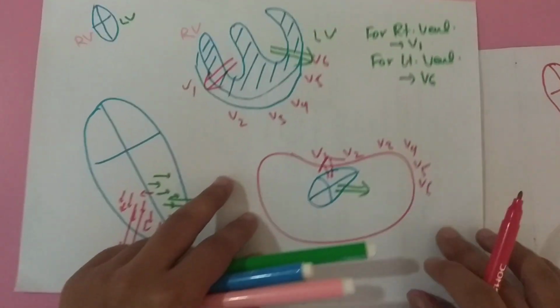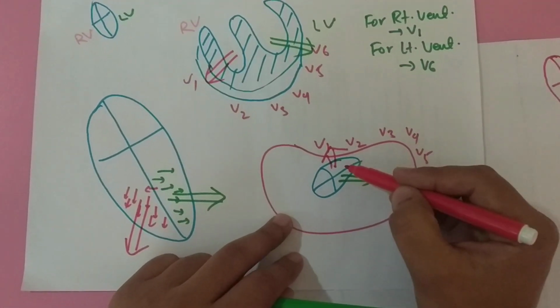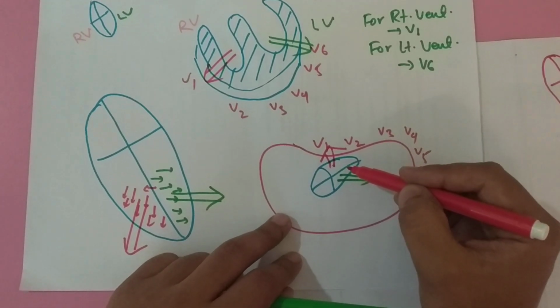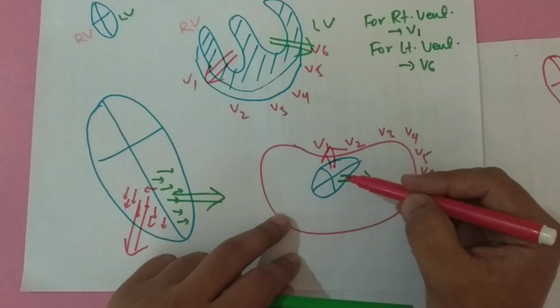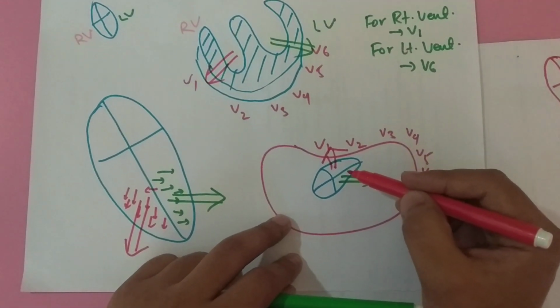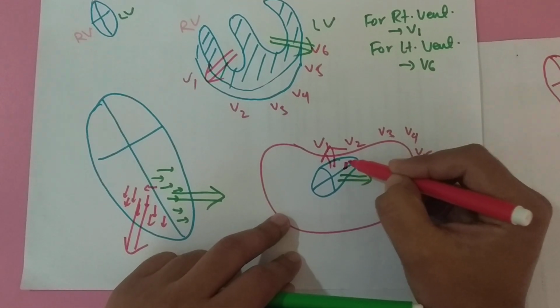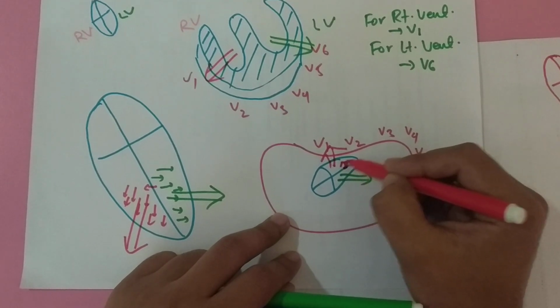Here you see there will be slight septal depolarization towards the right side, isn't it?